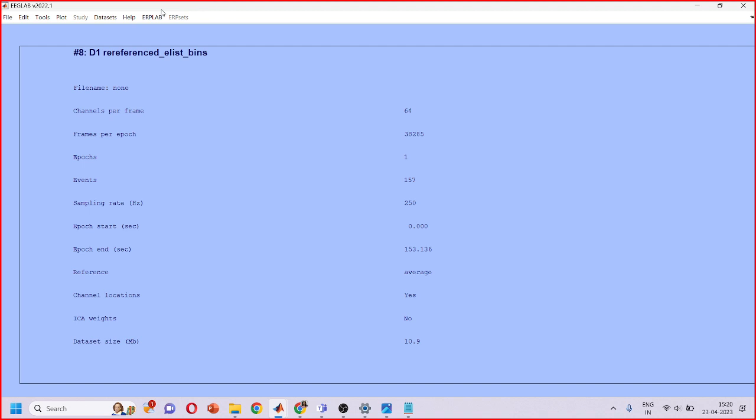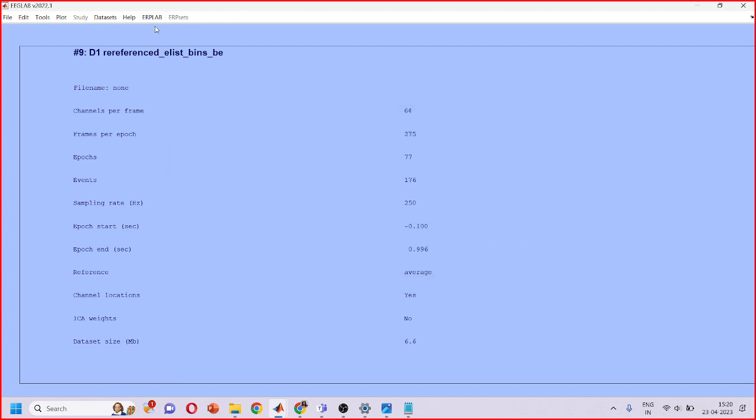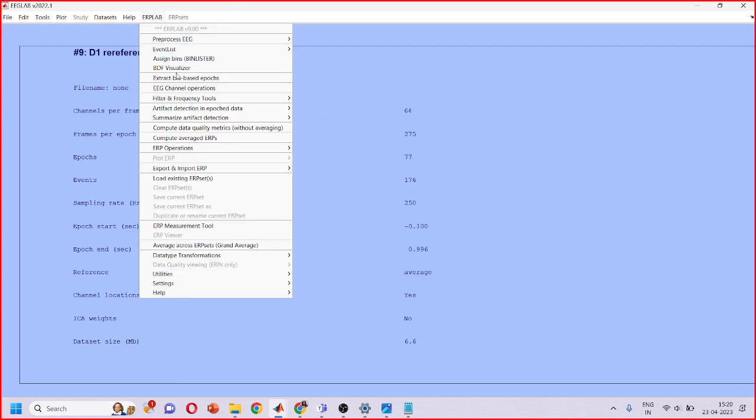Since this is flankers, though I had given 3000 milliseconds for the person to react, whatever components appear, they appear more prominently in 1000 milliseconds, and that is the time that is required for the whole analysis. So I'll only take 1000 milliseconds and not further than that. But if you require in-depth analysis, you can always go ahead and take more time.